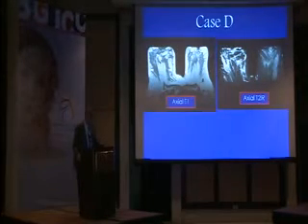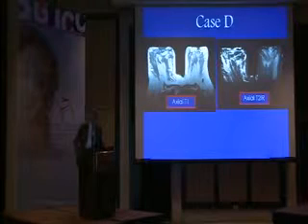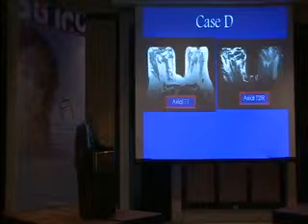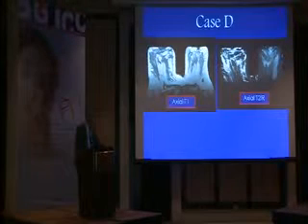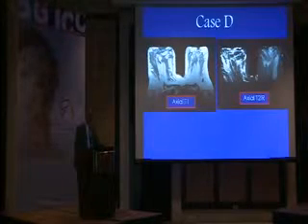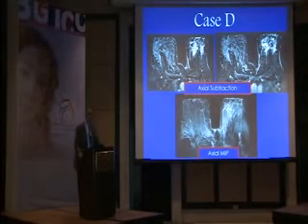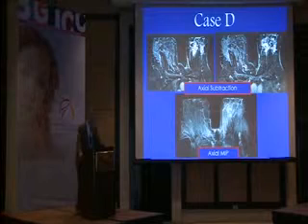This is the axial T1 and inversion recovery of the breast. Look carefully. And this is the subtraction image and the MIP image.